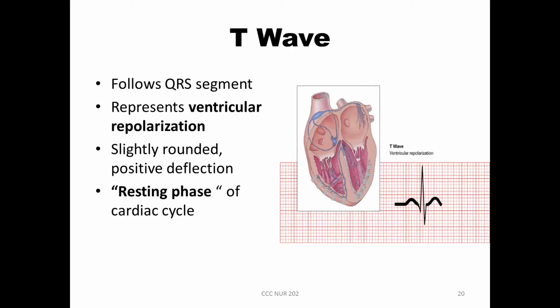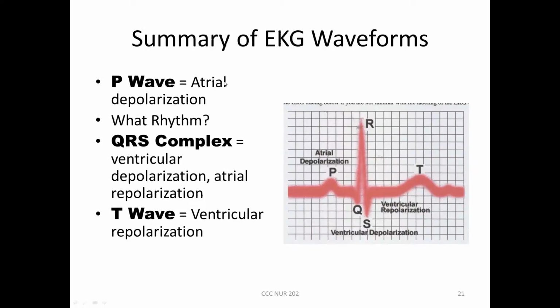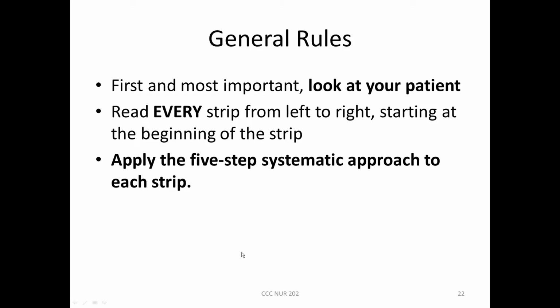And then, again, here's the QRS segment here. We just talked about that. So the P wave, the QRS complex, and the T wave is what we're looking at. And it's depolarization, and repolarization with the T wave.